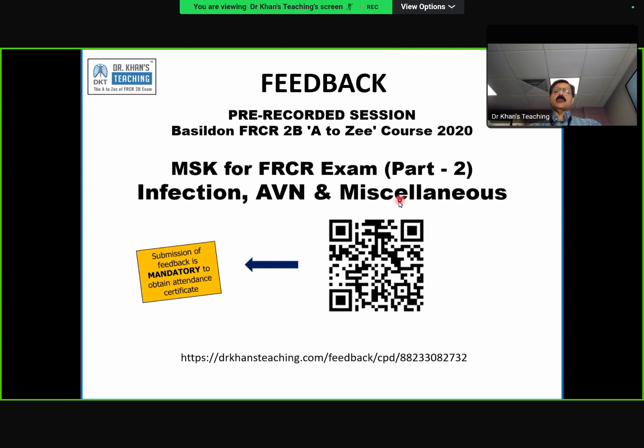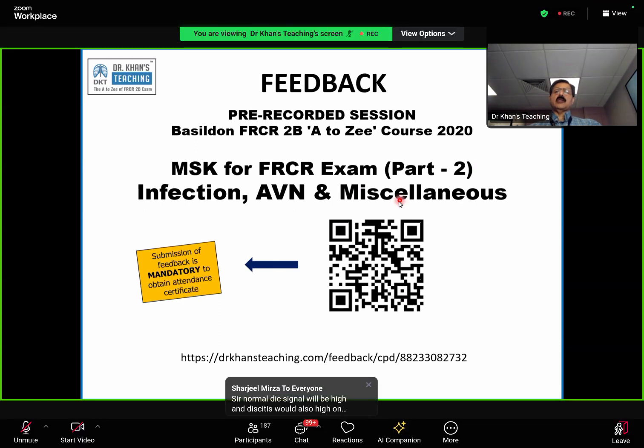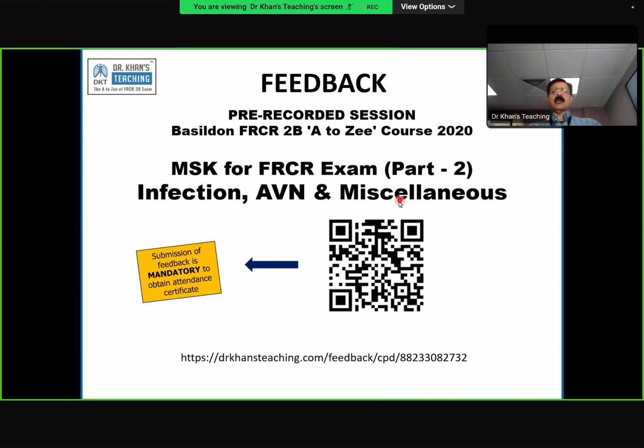GCT or malignant transformation of a GCT, if you say that, because there was periosteal reaction, usually there is no periosteal reaction. I will accept that if you say that. Spina ventosa will be seen in childhood. Paget's disease will be seen in old age. There is no way that you are going to confuse between the two. These are usually short tubular bones of the hands, and Paget's disease has a different distribution.